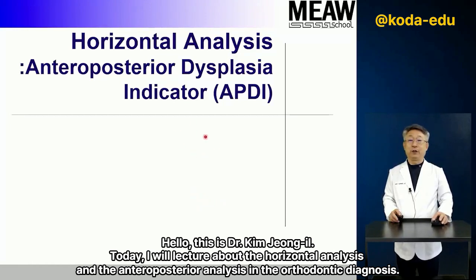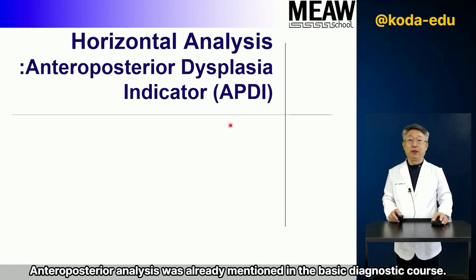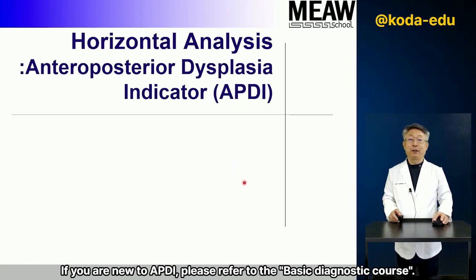Today, I will lecture about the horizontal analysis and the anteroposterior analysis in the orthodontic diagnosis. Anteroposterior analysis was already mentioned in the basic diagnostic course. If you are new to APDI, please refer to the basic diagnostic course.